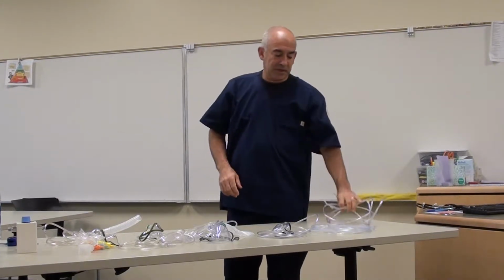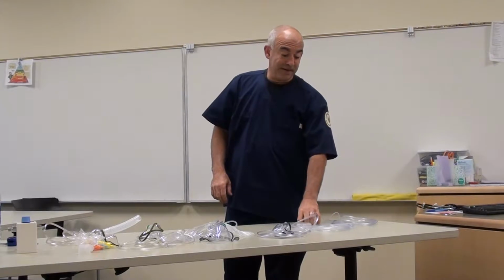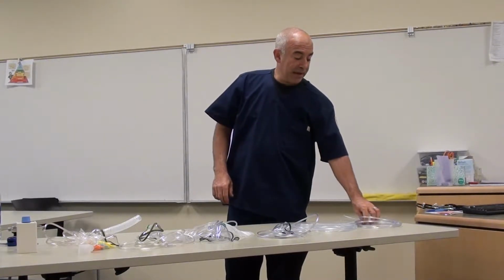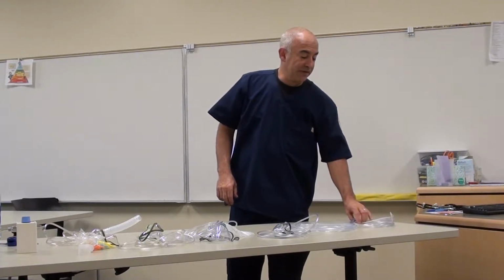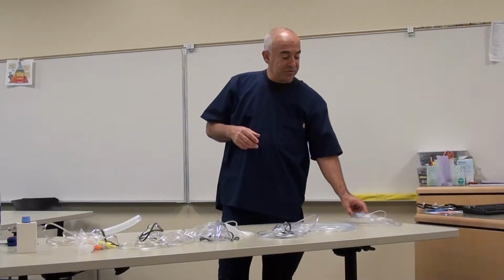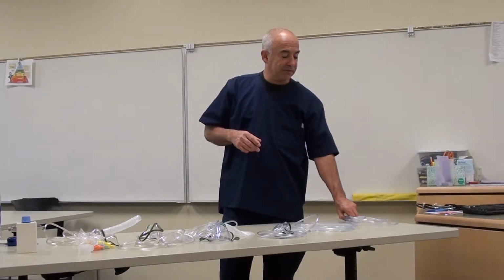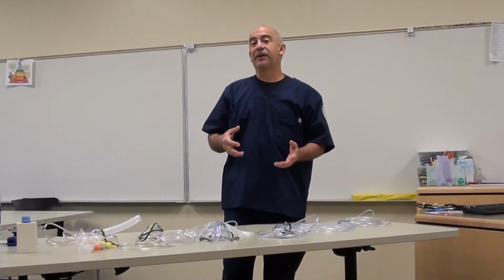The next device I'm going to talk about today is the, in fact, before I go on, since we were just talking about the nasal cannula and the FiO2 percentages on this device, I'd like to show you an easy way to calculate what FiO2 the patient would be delivered using a nasal cannula. It's called the 4% rule, and basically for every liter per minute of flow that's delivered through a nasal cannula, you can estimate that there'll be an increase of 4% to the FiO2.